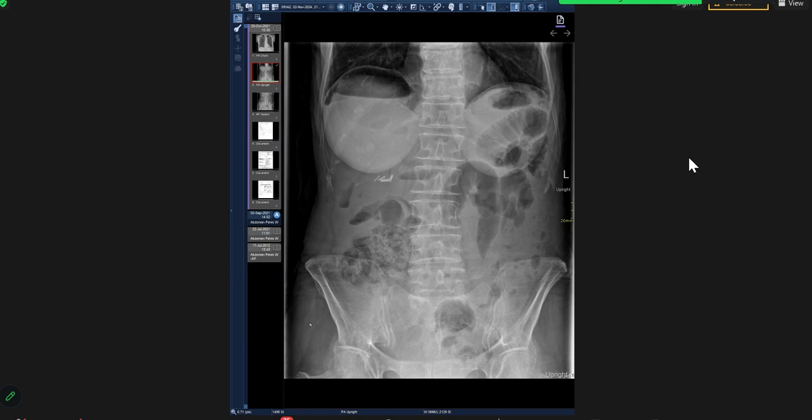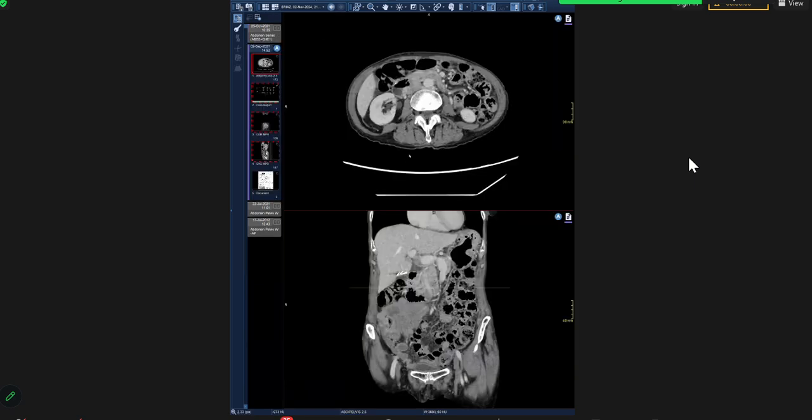I don't appreciate any evidence of pneumobilia or portal venous gas in this image. Bones appear unremarkable to me. So in this X-ray, my findings are in favor of small bowel obstruction with pneumoperitoneum. Next, I would like to proceed with contrast-enhanced CT of the patient to look for its cause.